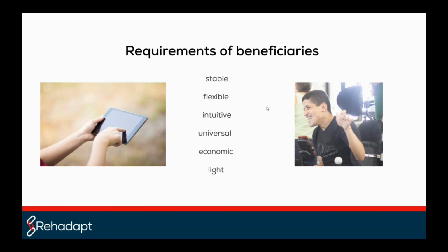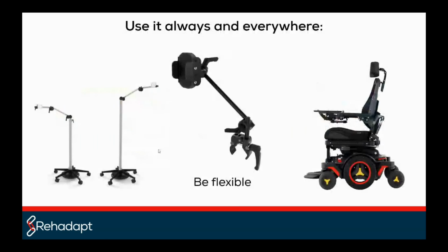And it should also be very light. So this is, for example, our L3D mount. And as you can see, I can hold it with the power of just a single finger. This is important because when assistants want to install the communication or the tablet system, the iPad, to a customer's wheelchair, they should not need to be as strong as a bodybuilder to handle the mounting brackets. And they should also be nice to look at.